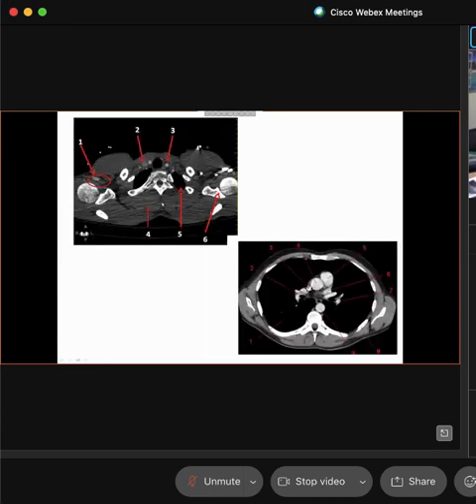So when we look at this image here, find your vertebrae. That's where you go first. You see that this is bony. It's right in the middle of your image, of your slice. Look laterally. We see some ribs. I can see a transverse process, and I know that you don't know the anatomy just quite yet, but I want you to look at your vertebrae, and I want you to see what bony anatomy lies there. Also, immediately beyond that, we see space. We see darkness. We know that that is air, right?